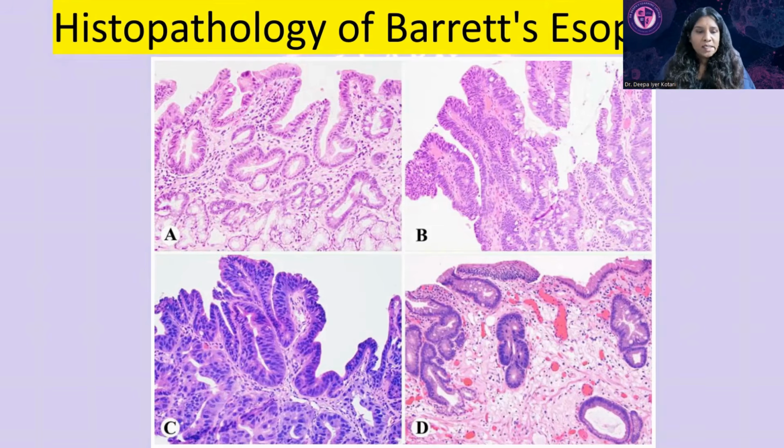Now let's carefully look at the C image. What you're seeing here, more stratification clearly. So more nuclear pleomorphism clearly, isn't it? Even at this power, you can very clearly see. So here, this is a high-grade dysplasia that I'm showing you. The high-grade dysplasia exhibits both cytological atypia and significant architectural abnormality. So the architectural abnormality is the basic difference between the low-grade and the high-grade. But the basement membrane is intact, even in high-grade dysplasia, that is never breached.